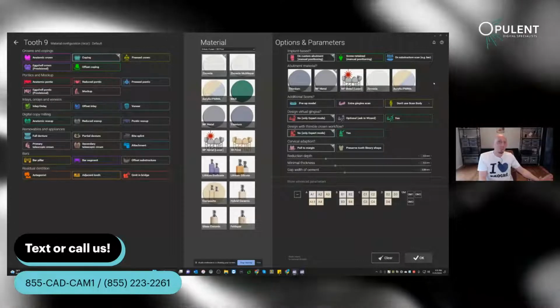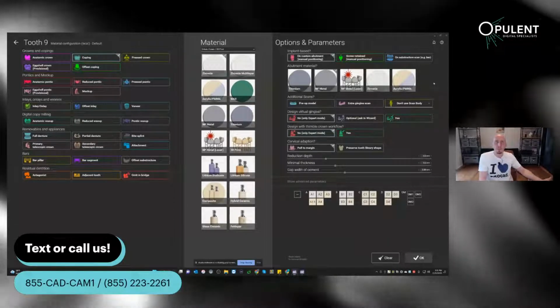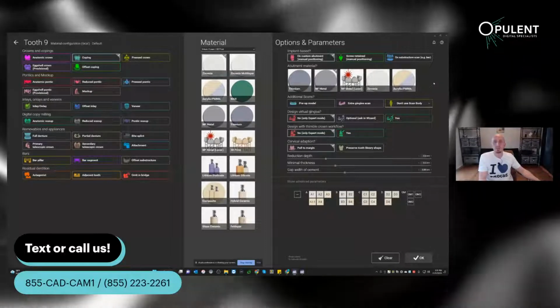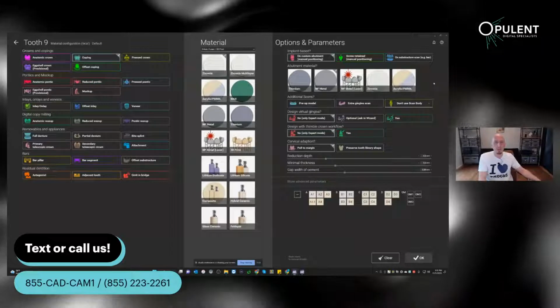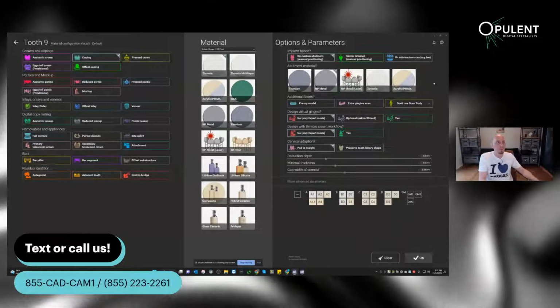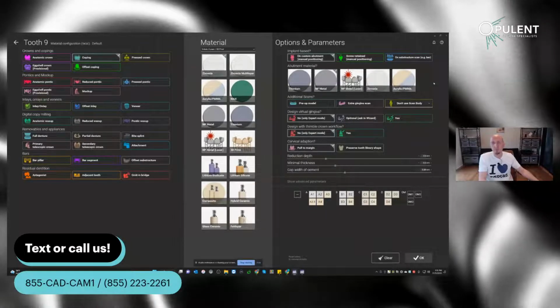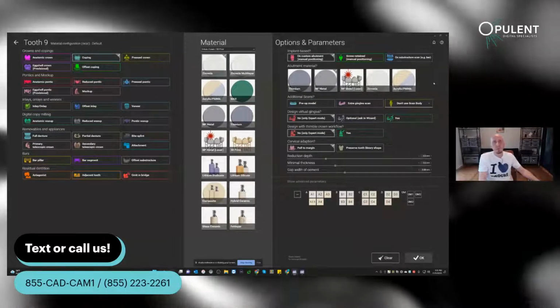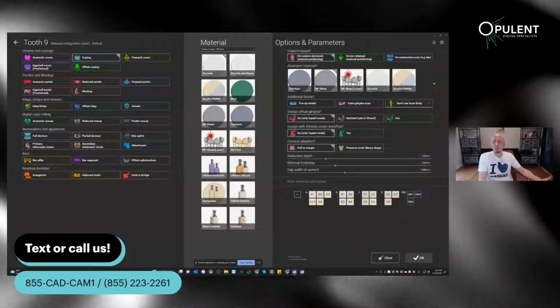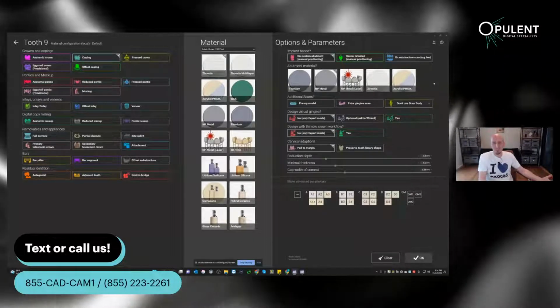And don't misunderstand me. I would always recommend you to use a scan body if you have the option to do that. It's just more accurate, it's easier, it works out of the box. But there are situations where I found myself in, and I've seen friends and lab owners find themselves in, where you got the library after you figured out there are actually 3 libraries, at least, sometimes even more.